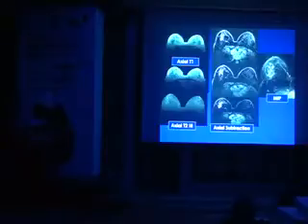So this is the MRI. And as you can see, the main finding here is the enhancement, taking most of the outer lower quadrants, maybe upper outer, I don't recall. But anyhow, this is the enhancing foci.